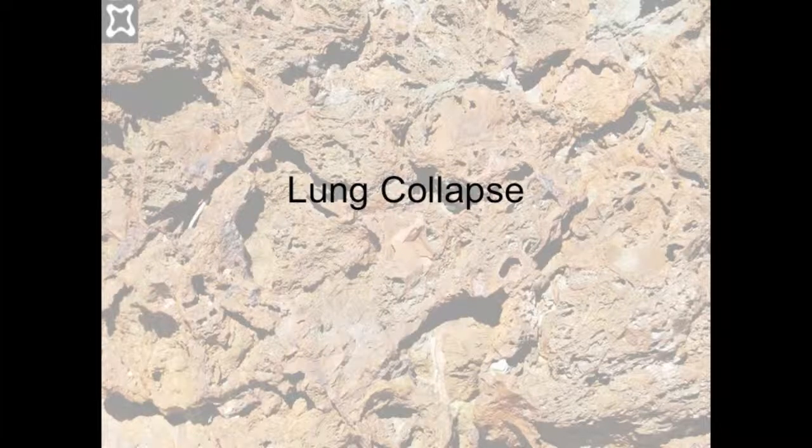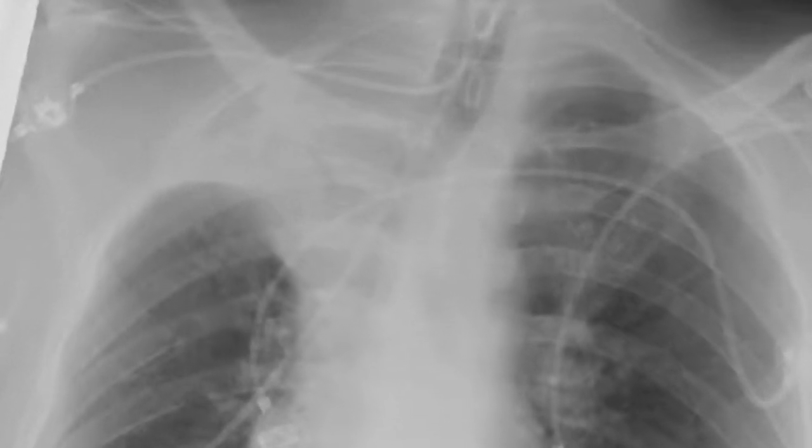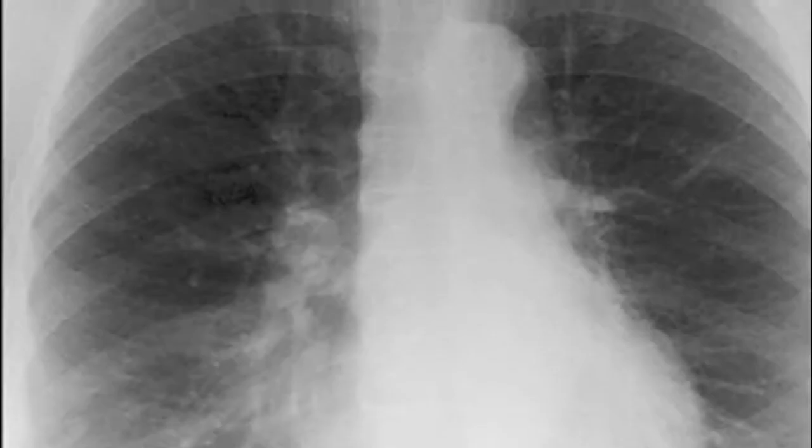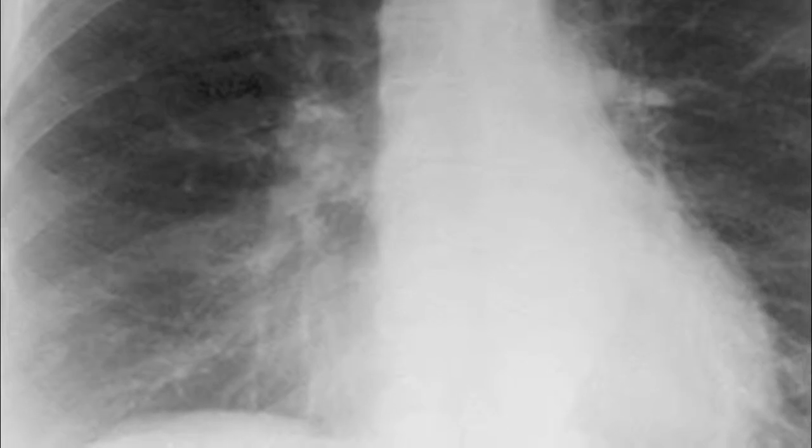Collapse of a segment of lung occurs when the ventilation to that part of the lung is prevented. The causes of collapse can include many serious pathologies, and the collapse itself can be of significant importance. For these reasons, it is important to be able to identify it quickly.